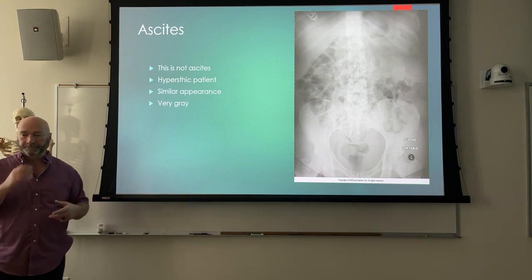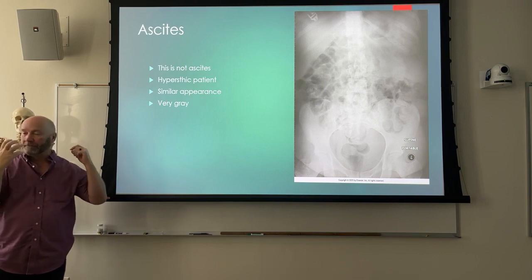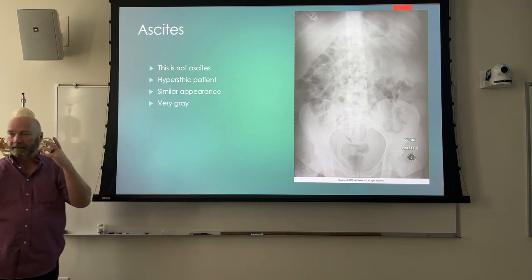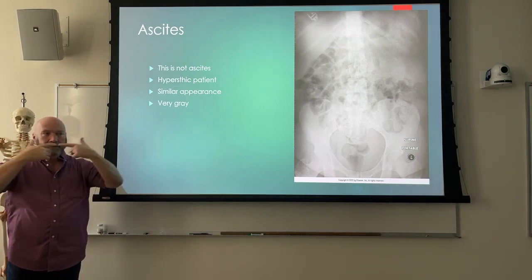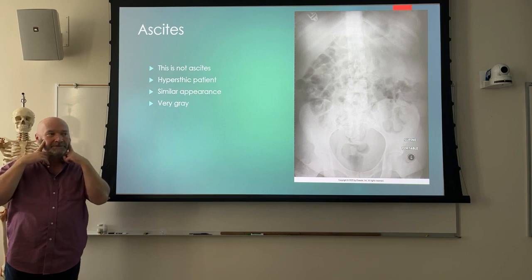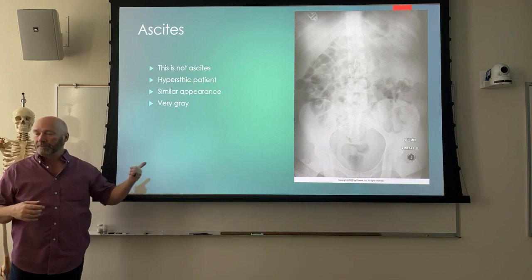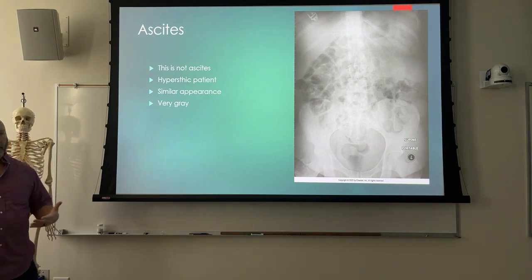Also, look at the patient. If the patient has a mask on, I don't mean a COVID mask, but like a respirator, and that strap going across their face is just kind of mashed into them, that's a good indication the patient's full of water, because you just don't get water only in the stomach, you get water everywhere.